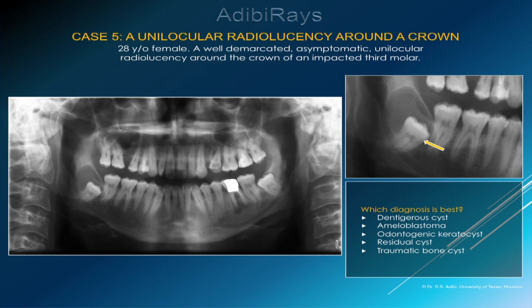Is it a dentigerous cyst, ameloblastoma, odontogenic keratocyst, residual cyst, or a traumatic cyst?